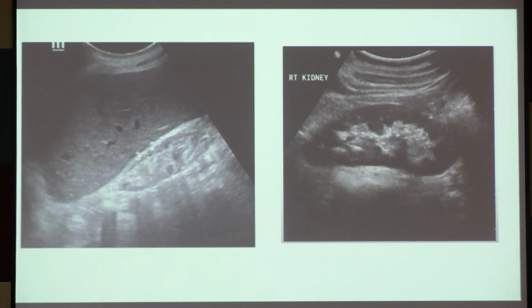Any CKD patient will have the CMD altered. Also, if you measure the size of the kidney, it has become shrunken. It has got shorter in size because of the repeated cortical scarring that takes place. So that is the difference between a normal kidney and a CKD kidney.